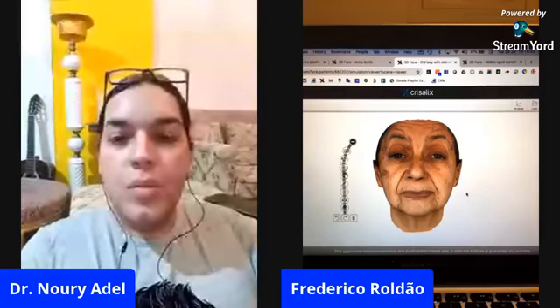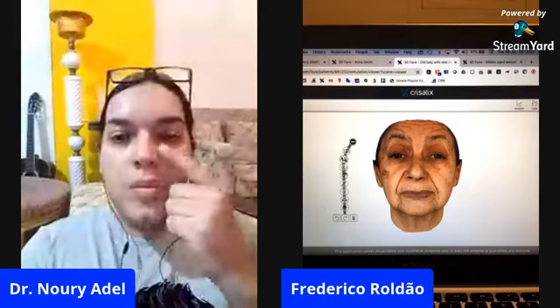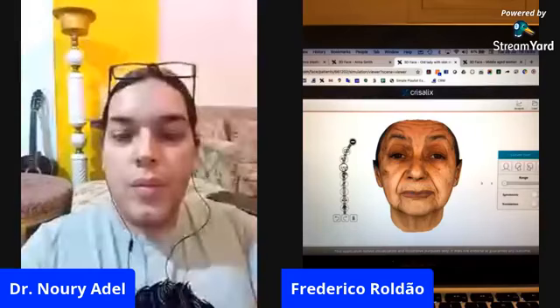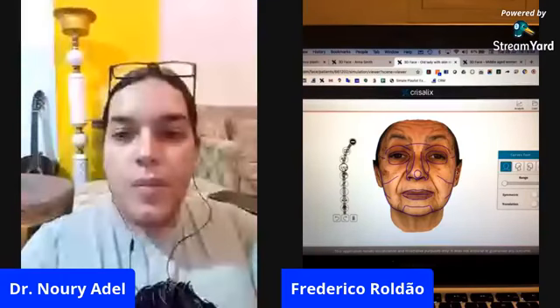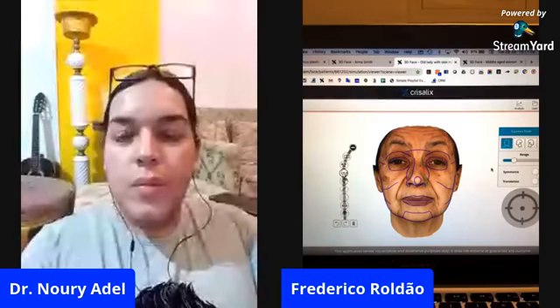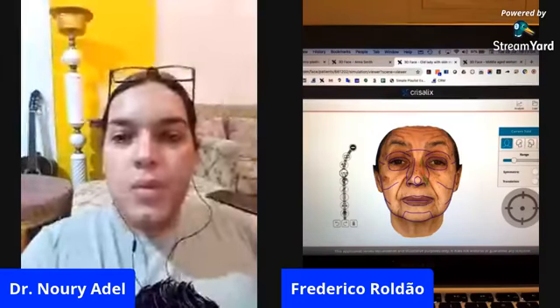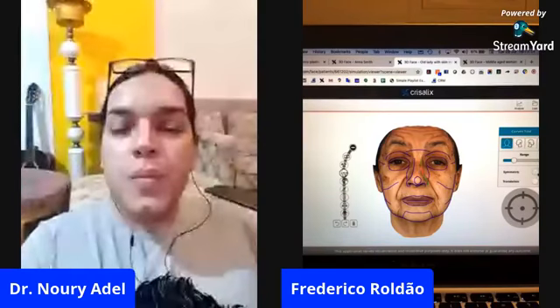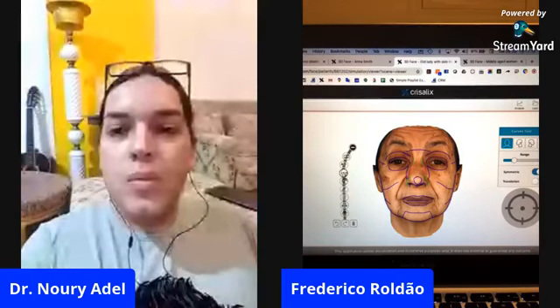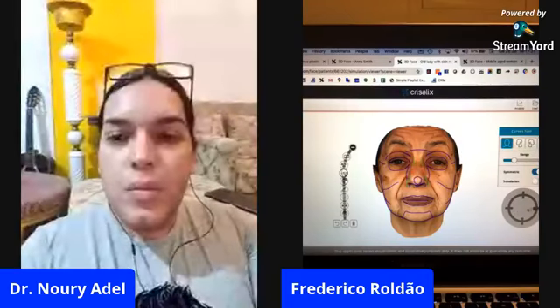And I will start by showing you some basic tools that allow you in a very easy way to do some simulations on the patient. I will start by doing some shape changes. So for instance, if I want to narrow or widen the nose, if you see, I touched that line and it became red. Now if I tap this button here, symmetric, then I can play with her nose. I will exaggerate so that you can see what I'm doing. Can you see as I change the nose?